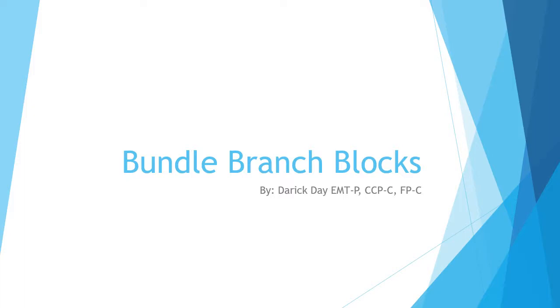On this episode we're going to discuss diagnosing bundle branch blocks on the ECG. These can prove difficult, especially for the newer providers, and especially when we start talking about bundle branch blocks in the presence of tachycardia. The faster rhythms can make it a little bit more difficult to know what we're looking at and can make certain people nervous when they're trying to diagnose their patient and they see a wide, fast rhythm going across the monitor.